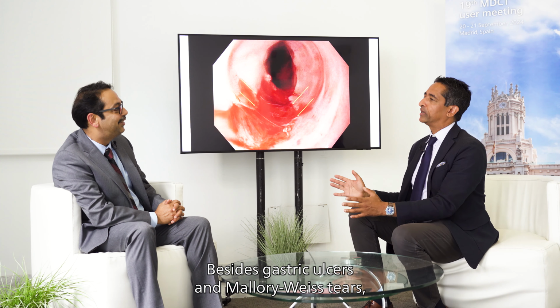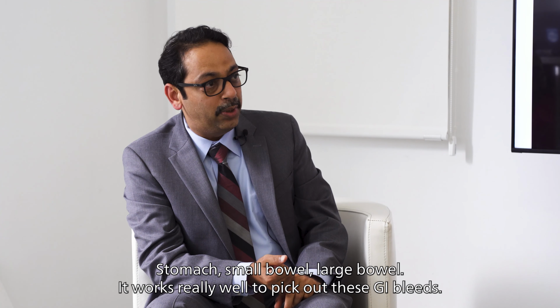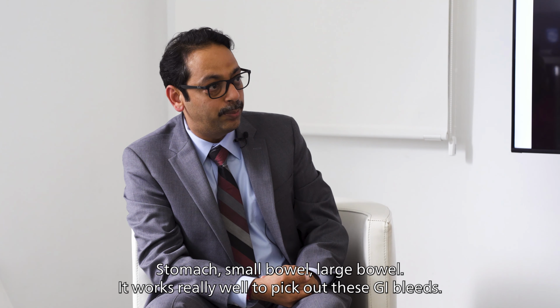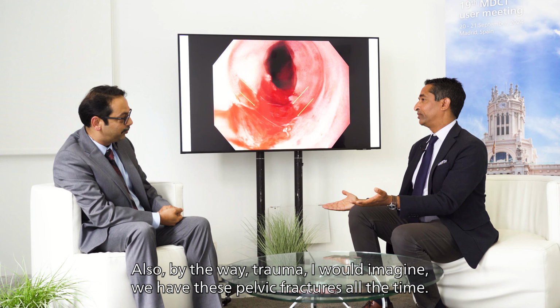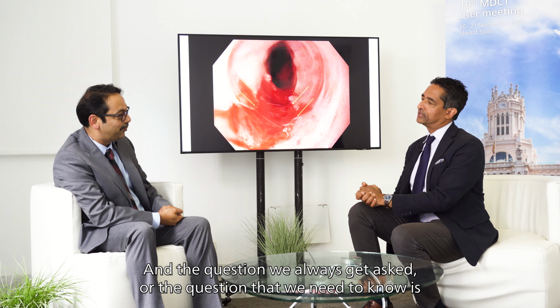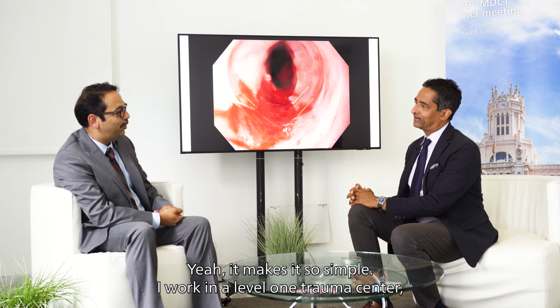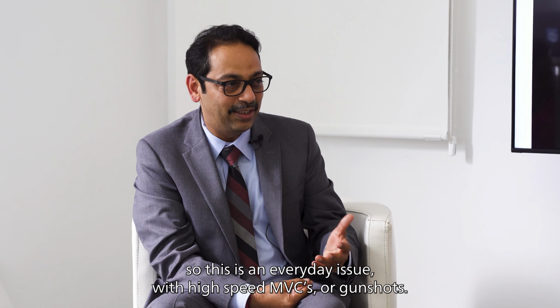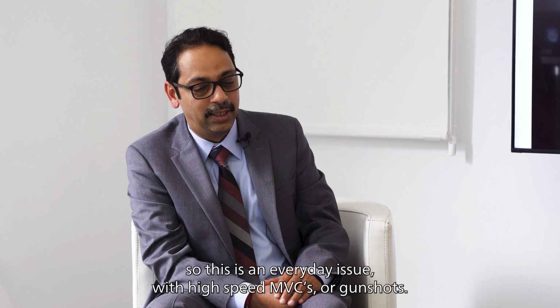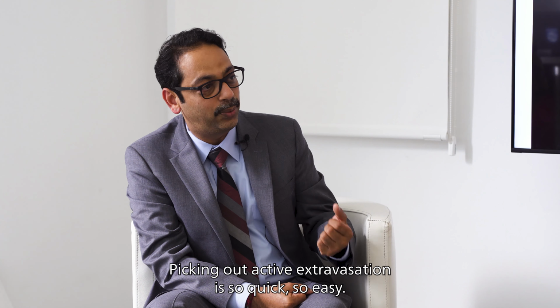Besides gastric ulcers and Mallory-Weiss tears, are you looking at GI bleeds routinely with spectral now? Yes, so GI bleeds anywhere. Stomach, small bowel, large bowel works really well to pick out these GI bleeds. Also, by the way, trauma, I would imagine, we have these pelvic fractures all the time. And the question we always get asked, the question that we need to know, is this a bone fragment or is this active extravasation requiring intervention? Yeah, it makes it so simple, and I work in a level 1 trauma center, so this is an everyday issue with high-speed MVCs or gunshots. Picking out active extravasation is so quick, so easy, and very, very simple.